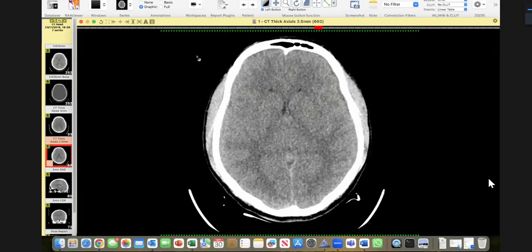Okay, sir, I am provided with CT brain plain axial slices. This headache is going on for a while, for a few days. Okay, sir. So okay, I'm provided with CT brain plain.